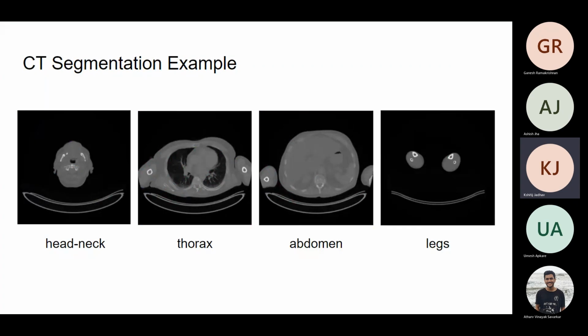So that is really very important. Suppose we have a pelvic region. In the pelvic region, a very high count, very high SUV doesn't necessarily mean that it is a tumor. Correct. Maybe the bladder. The urine bladder has it. Yeah. So from that perspective, I think it's better to do the segmentation part by part.